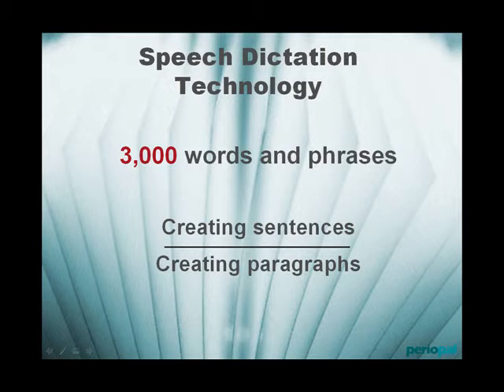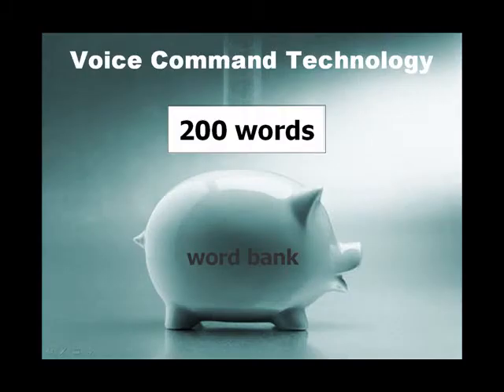Voice dictation is designed for building text sentences and paragraphs. Voice command technology restricts the vocabulary to 200 chosen words, significantly improving accuracy and speed in word recognition. With PerioPal, there are fewer than 200 recognized words with any given screen.